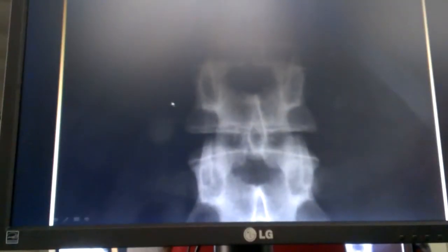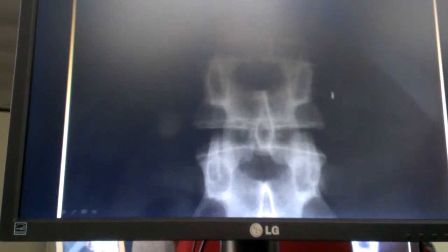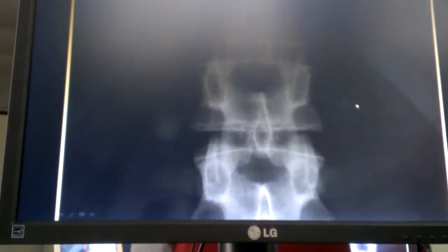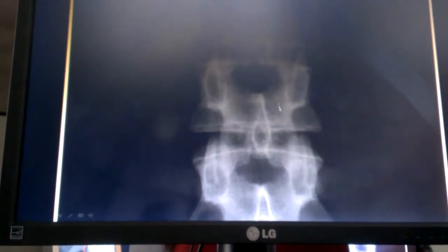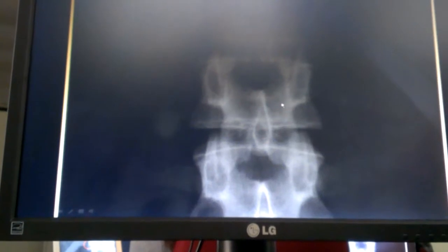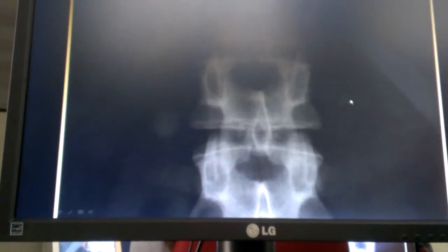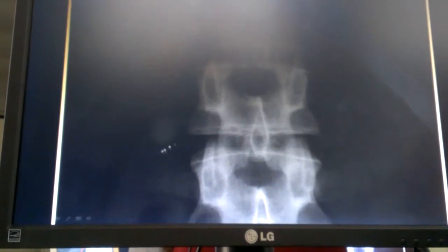Here, this is an unfused apophysis. This one, maybe because it's a little bit larger, we can refer to as maybe a lumbar rib, providing that this is, I can't tell, this might not be L1, this could be T12, right? And you get these differences. Or you can have agenesis of 12 thoracic ribs as well, right?